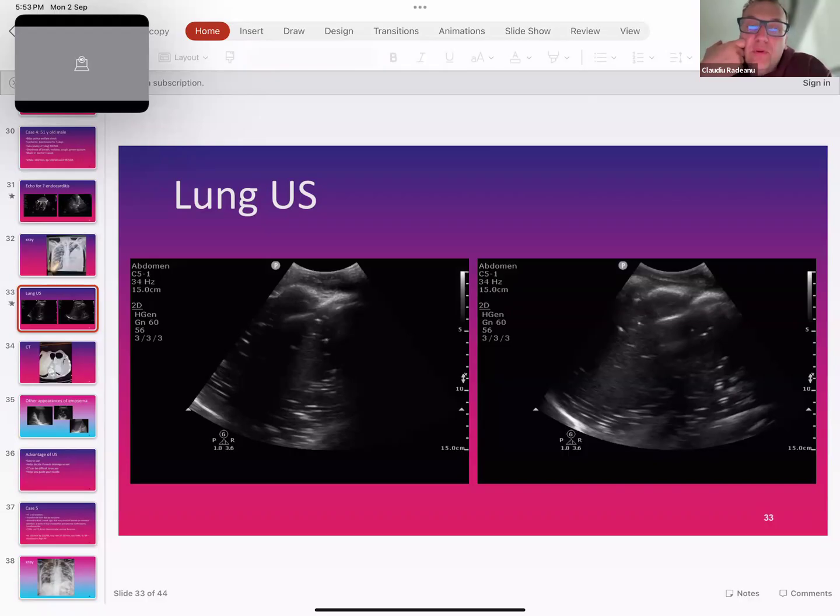Now, in terms of pathology, we talked about pulmonary edema. That is the B-line, the long beams. We talked about ARDS, when you look at acute lung injury, where you have a normal heart, but you have a lot of pulmonary edema. So think about acute lung injury because the treatment is completely different.